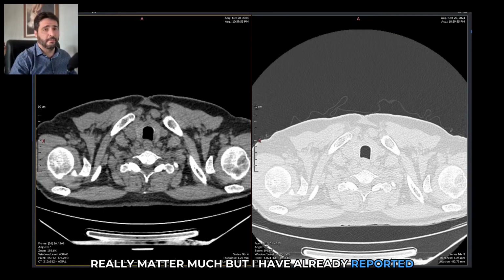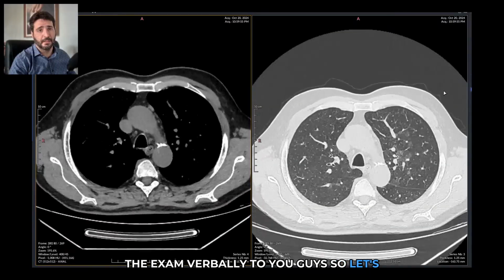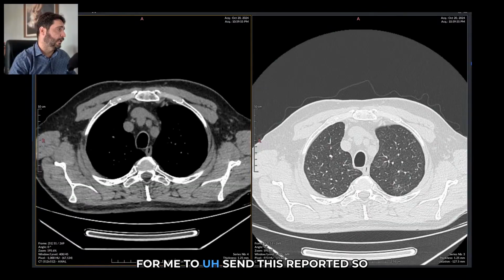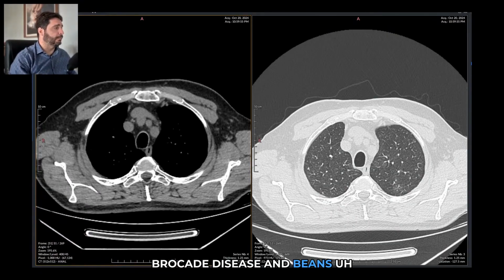I have already reported the exam verbally to you guys, so let's just give me a couple of minutes for me to send this reported so we can go to the next one. So bronchiectasis and bands.